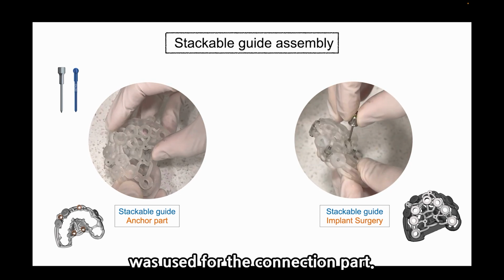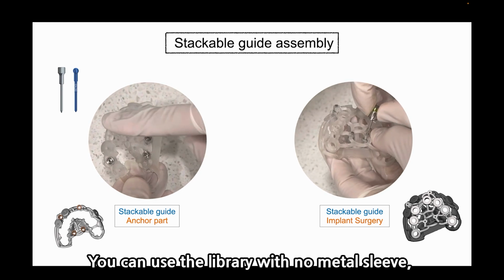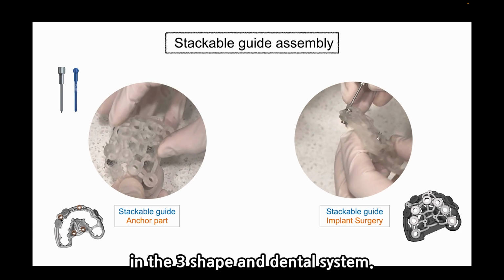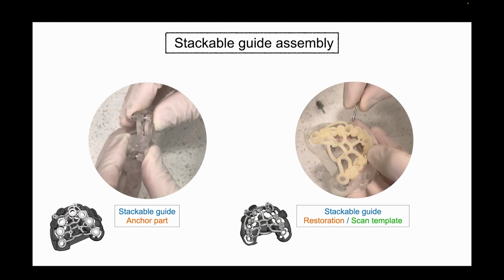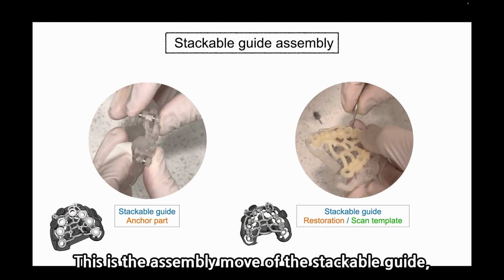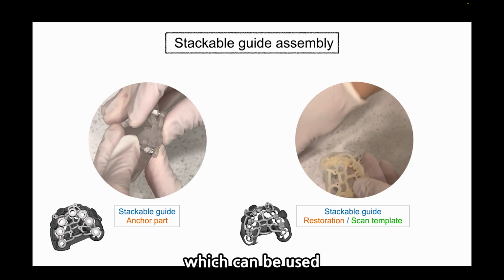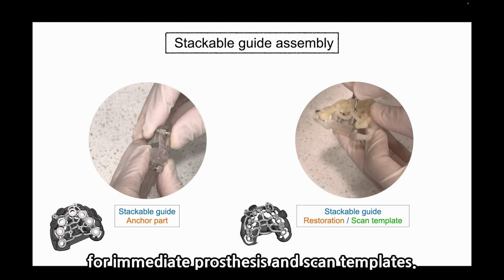We can use the library with the non-metal sleeve in 3Shape Dental CAD/CAM. This is the assembly of the stackable guide, which can be used for immediate prosthetics and scan template.